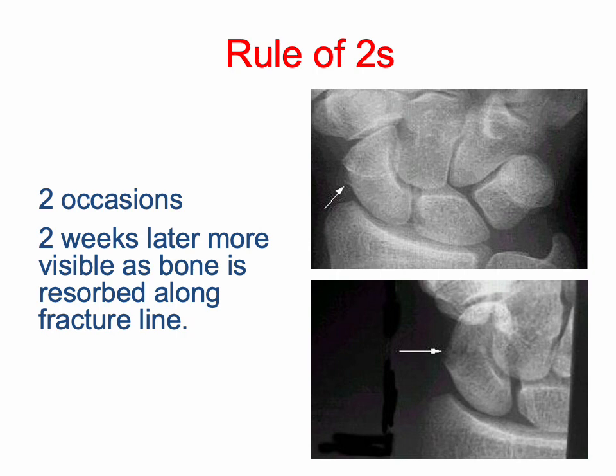And on two occasions, like I was talking about with scaphoids, it's not so visible that there's a fracture in the initial imaging, but on follow-up imaging two weeks later, you can see there's more bone that's been resorbed along fracture lines, so it becomes more apparent.